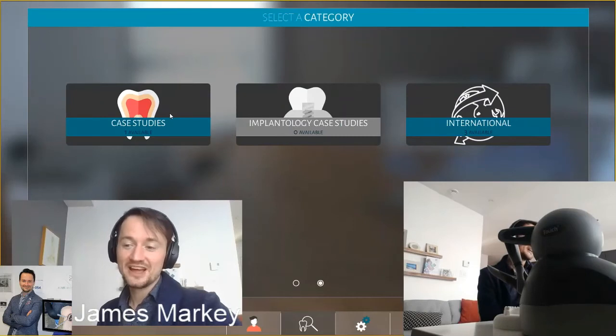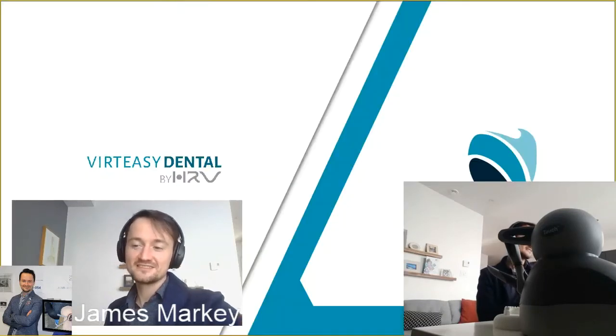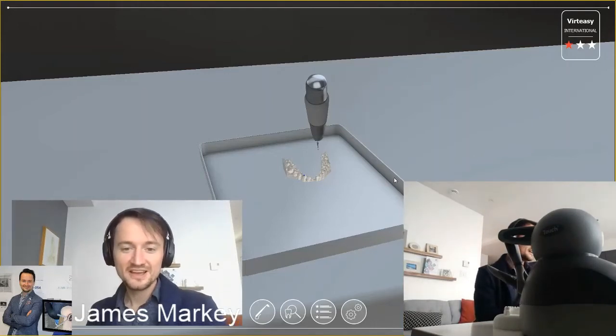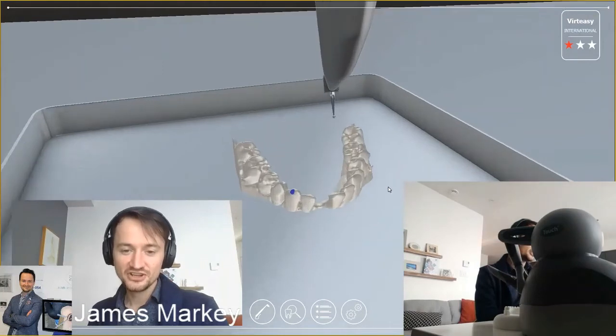But on page 2, we have case studies and international. So let's select this one, and we'll see one with today's date. So then we'll just load that up into Virteasy Dental. So here we are in Virteasy Dental, and we can see the Intra-Oral scan that we took earlier.